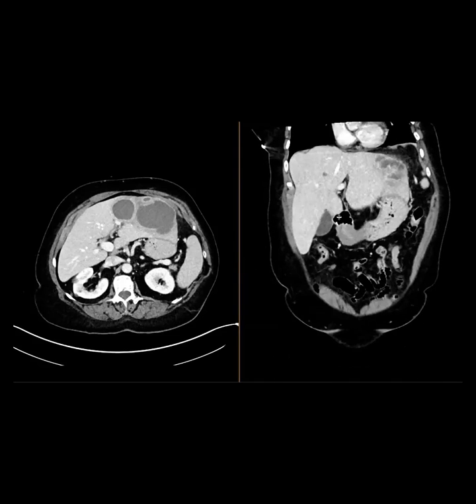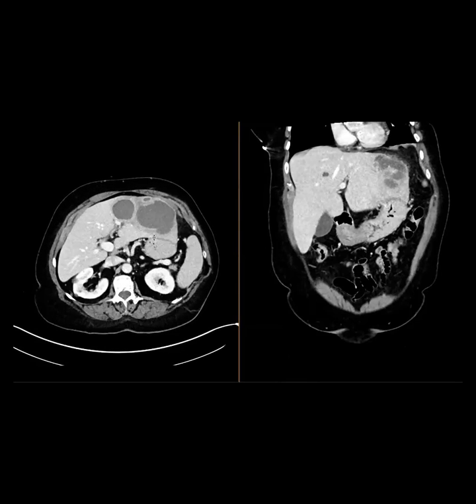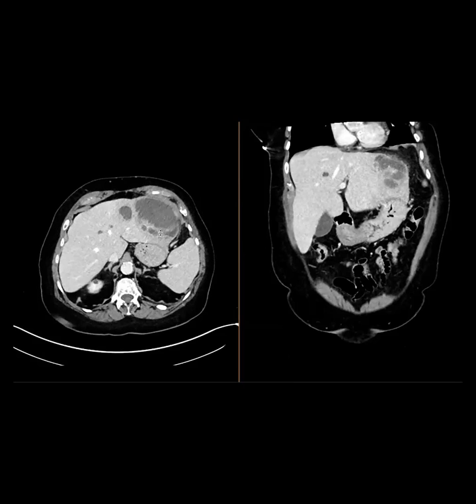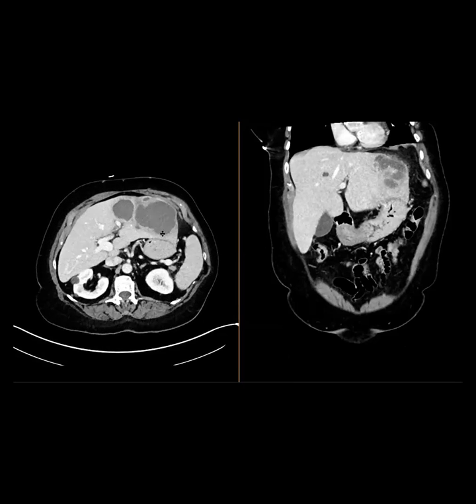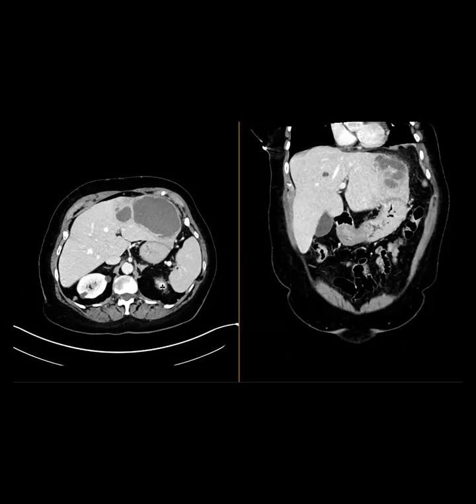Yeah, that's what we were thinking as well. So these low signal intensity, multiloculated, peripheral enhancing lesions. It's a CT, not MR. CT. Did I say MR? Anyways, and like he said, it's isolated to the left hepatic lobe. In fact, I think I showed Cookie that case when she was here as a professor, and she thought it was pretty cool too.